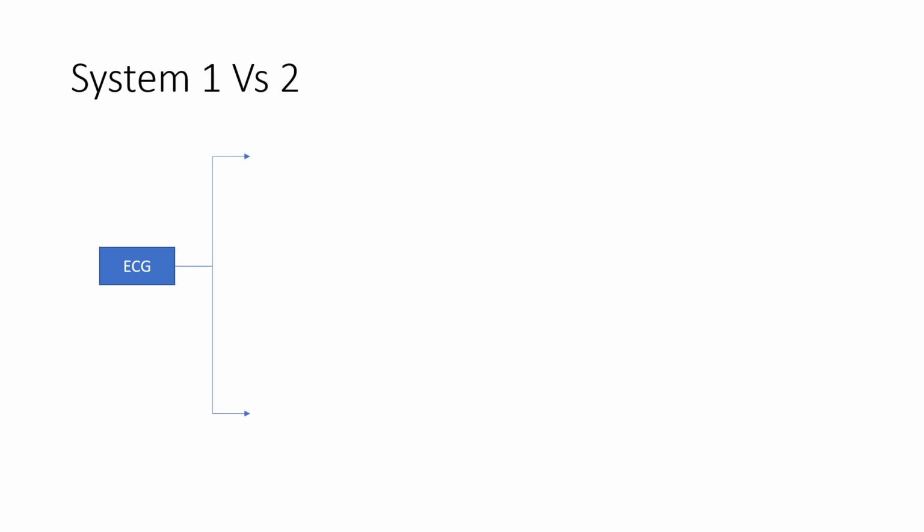All right. When we look at our ECGs, as I've been alluding to, we have two ways of looking at it. Either we can look at it from a more systematic approach, like a bottom up, where we do a thorough analysis of the ECG every time. That is not how we usually look at ECGs, at least not when we have been doing this for a while, because then we have some kind of pattern recognition.